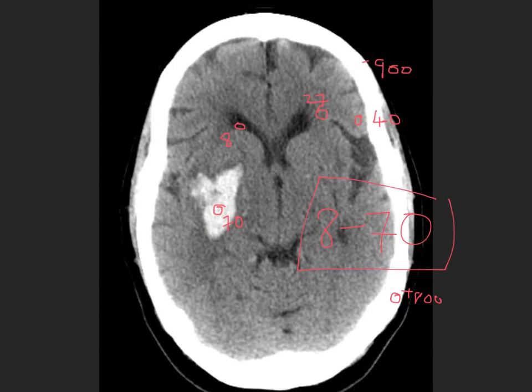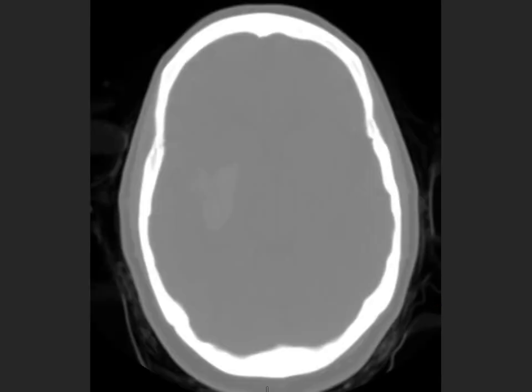Now this image here has been shown on a typical brain window, which we'll explain further in a minute. But what about if we tried to look at this image on a display that showed all 2,000 Hounsfield units over those 256 shades of grey? This is what that image would look like. As you can see, there is no diagnostic information that could be obtained from it whatsoever. So what we want to do is focus down those 256 shades of grey into a very narrow window or region of Hounsfield units which contain the relevant densities for the tissue that we're interested in.